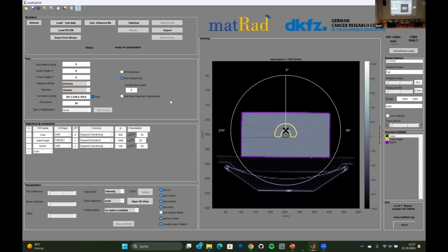In the background, usually matRad configures the resolution a little bit lower so that it doesn't take too long. But nothing happens yet, because we do not really have a dose yet. We know the dose of each individual beamlet, but we do not know how intensely each beamlet should be applied. As an intermediate step, I now quickly go into the background of what happens, because I don't know how many people are interested in mathematics, physics, or computational stuff like coding. One person online might be.